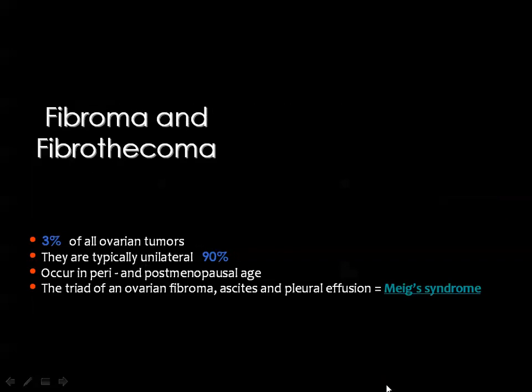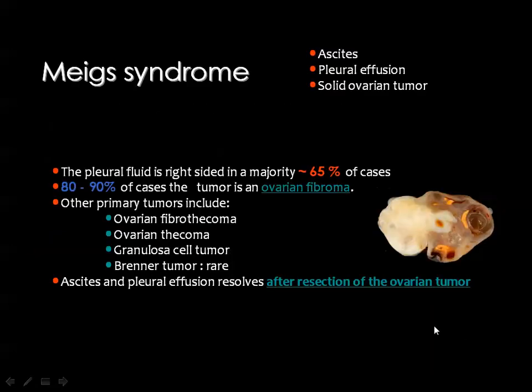And this is also an example, and you see a big lesion containing internal septations and of bright signal in all T2 weighted images. In the ovarian fibroma, you know its relation with what's known as Meigs syndrome, where you get ascites, pleural effusion, and solid ovarian tumor. I have said in the introduction that lesions that contain fibrous tissue will appear black in all sequences, in the T1 and T2.